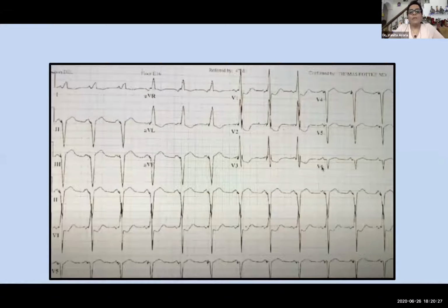And a word of suggestion here is that when you are doing biventricular pacing on the table, the most important lead that you can hook up to give you a better result is actually lead 1. You hook up lead 1 and you see whether lead 1 is converting into a negative or a positive when you pace the LV, and that gives you the answer there and then.